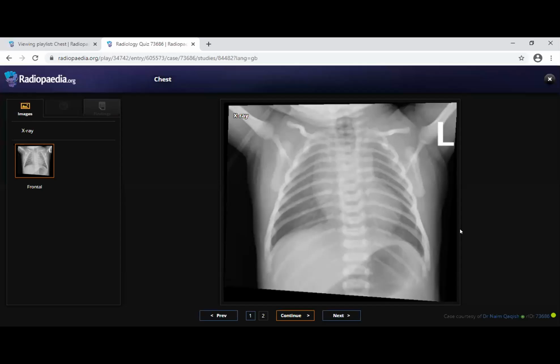I also see the esophagus is dilated and air filled with a blind distal end, with air in the stomach. The stomach is dilated and filled with air. So it could be esophageal atresia with distal tracheoesophageal fistula. Also, I see the shape of the heart could be abnormal, could be a vascular anomaly.